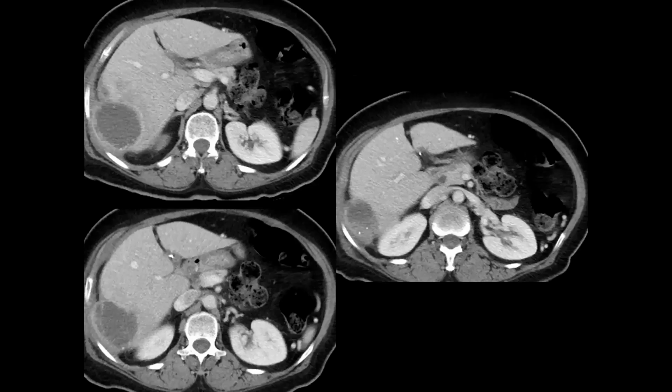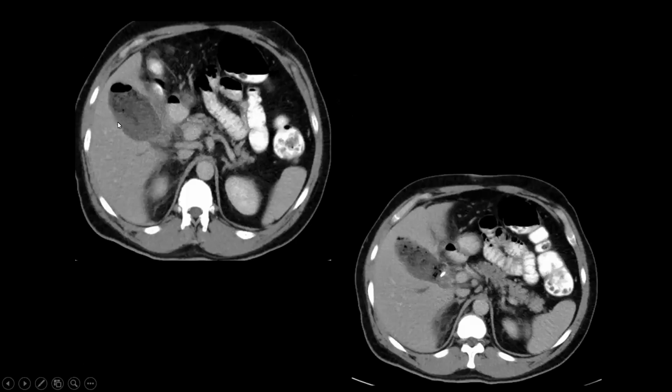After cholecystectomy, sometimes you can see some complications like abscess formation, or sometimes you can have bleeding. And this mottled structure within the lumen of the gallbladder after cholecystectomy is Surgicel, which, as you know, is a hemostatic agent and can look like mottled gas, sometimes mistaken as abscess or fecal matter because of the mottled appearance. We need the clinicians to tell us if they use Surgicel or any hemostatic agents during the procedure, so not to confuse the picture between normal postoperative findings versus abscess.